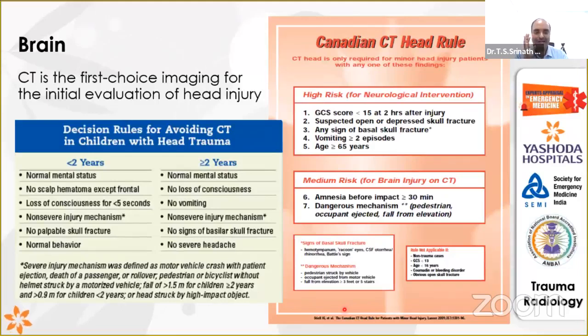is very important, because our heads are a fixed structure. It cannot increase in size. Where will it increase? It will just herniate. So that should not happen for your patient. So keep in your mind, blood can be very bad, especially in this particular situation. In this particular situation, it's very, very bad. And when you have this, there is a midline shift, it is a very dangerous situation. Again, intraparenchymal bleed, shifting. See here, these are the dangerous things. Whenever you see again like this, a skull fracture pushing the brain inside, that is also dangerous.